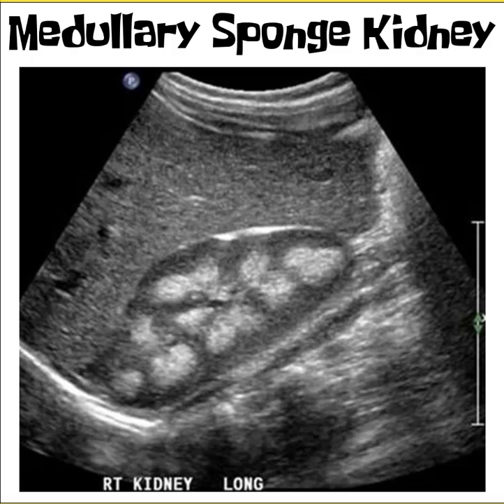So here's an example of a medullary sponge kidney. Again, the pyramids are very bright and echogenic. Remember, these are tiny little cysts within the pyramids. As the tiny little cysts hold on to urine, they're more likely to start to form stones. We can also see then that the cortex of the kidney is very thin. We want that to be over 1 centimeter. In the medullary sponge kidney, it usually is well under.